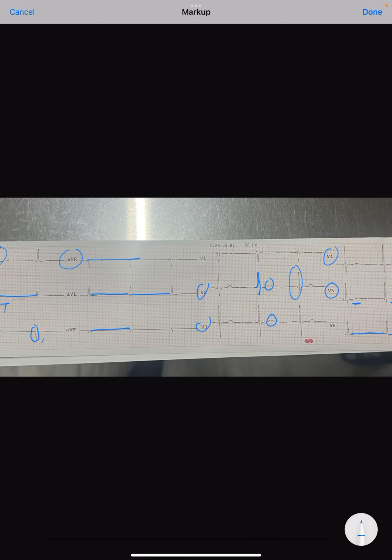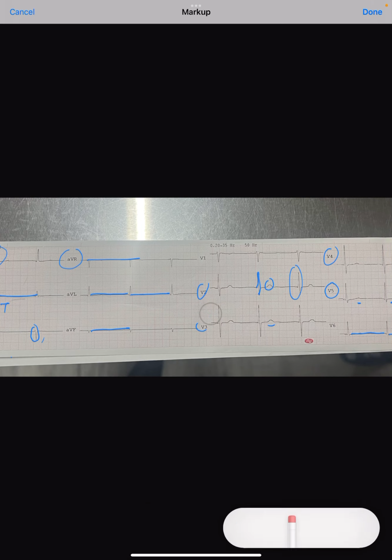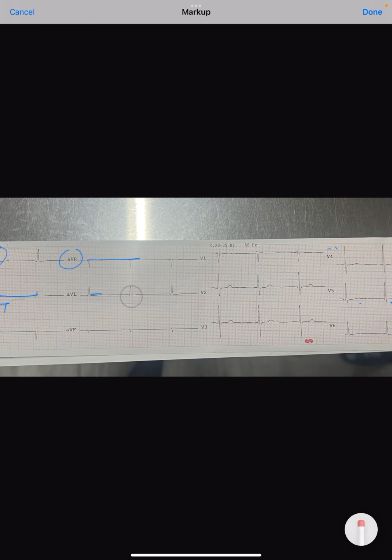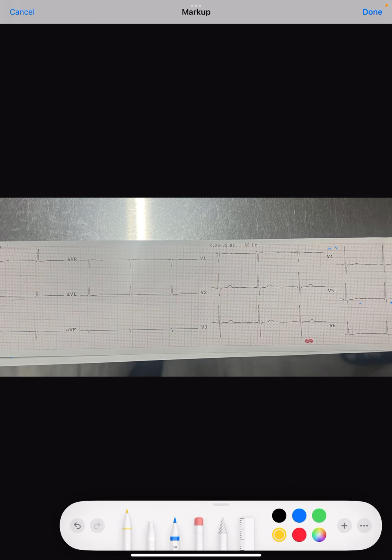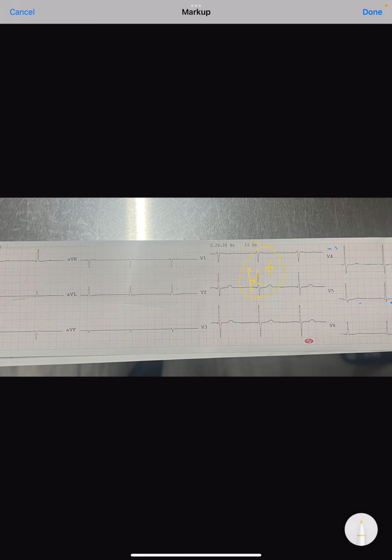We know very well that the T wave is a repolarization wave, and for repolarization, one of the most important ions is potassium. So if potassium is deficient, what you commonly get is low voltage complexes. Low voltage complex means that in the limb leads, the QRS will be less than around 5 millimeters in height, whereas in the chest leads, it may be less than 10 millimeters in height.